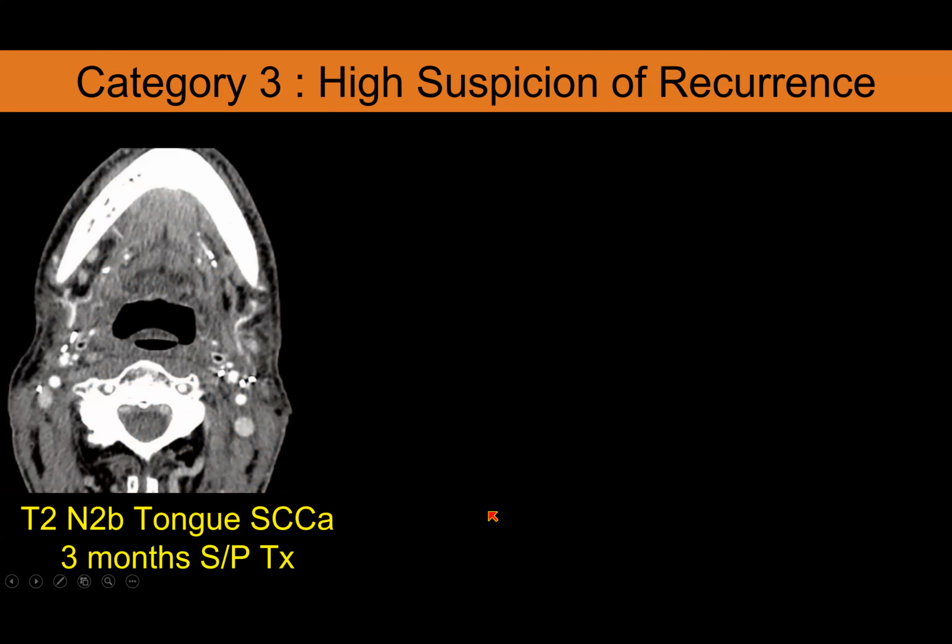So how about lymph nodes? Same kind of thing. Here's an axial CT. This patient is after therapy. It looks like post-radiation change, maybe a little wet and boggy in that area. Maybe the epiglottis is a little bit thickened. We've lost a lot of our expected fat planes, with thickening of the platysma. And we do see a lymph node over here on the side. Maybe it doesn't look that bad. This is 3 months after his therapy.